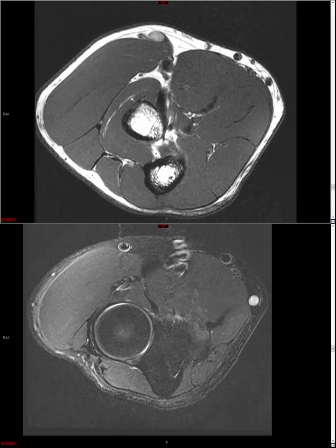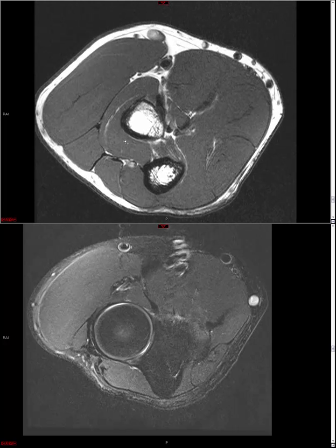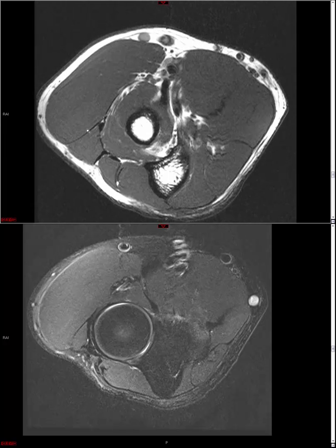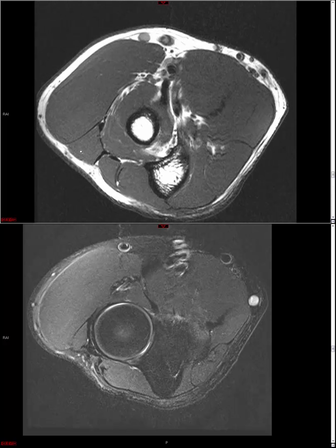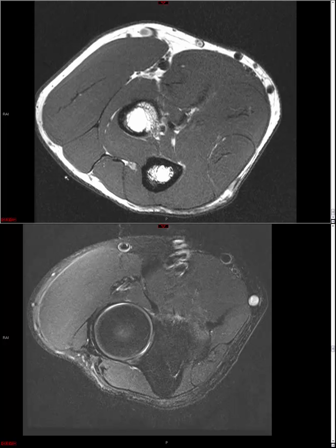So if you see, and you see this not infrequently, say there's a deep lipoma in the supinator muscle, what you might see is denervation, edema, or atrophy of all these extensor muscles. All right, so supinator muscle, brachioradialis, and then here we get into, I believe this is extensor carpi ulnaris, extensor digitorum, and then we're getting into extensor carpi radialis brevis. But these are muscles that, for now, you can probably just refer to as the extensor muscles.